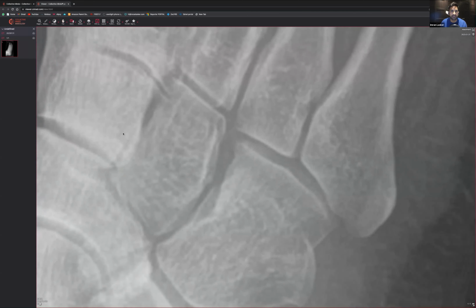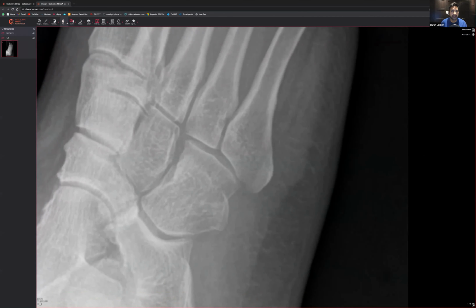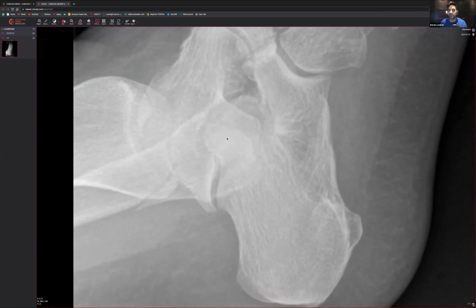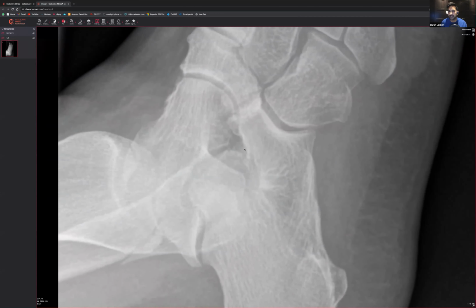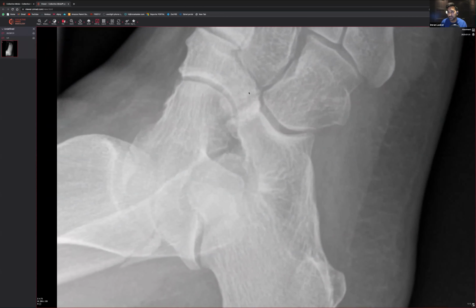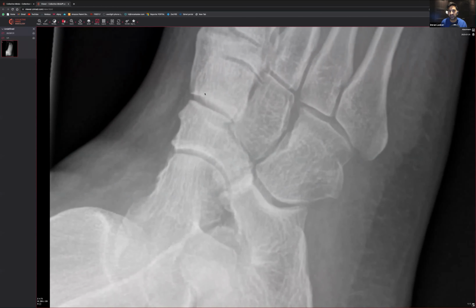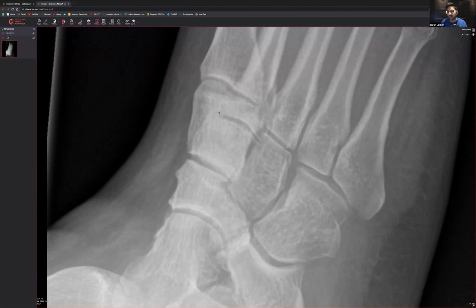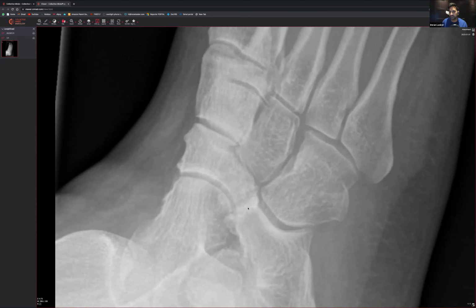And then you do want to zoom out a bit and then pan out. Navicular cuneiform. Very difficult to assess here. There's going to be a lot of overlap within this region, right? I'd be very aware to call anything. It's slightly at an angle. You've got medial, middle, and lateral cuneiforms over there. Then you've got your cuboid.